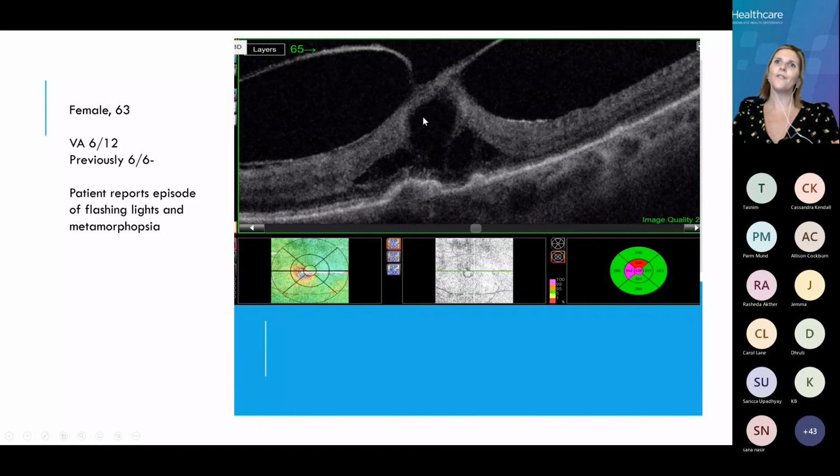We've got these large, very well-defined cystic spaces in the intraretinal section, and we know from the ILM down to our ELM, go to a point where the ELM is intact and follow through, and we can see the ELM changes, but it is still visible here. Okay, so it is still there. Now, we do have an epiretinal membrane, so we can see some sparkling, and the rest of the sections either side seem okay.